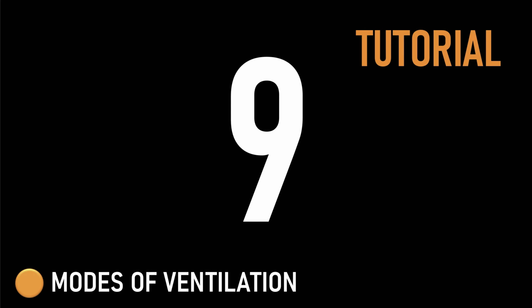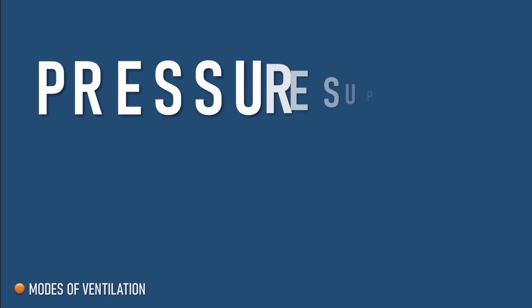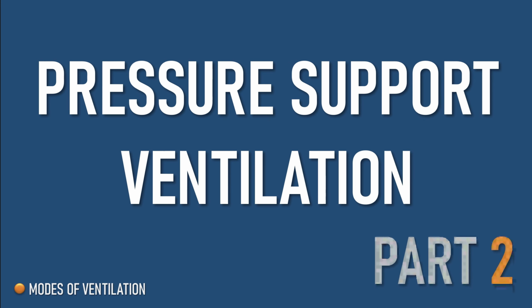Tutorial 9. Pressure support ventilation. Part 2.